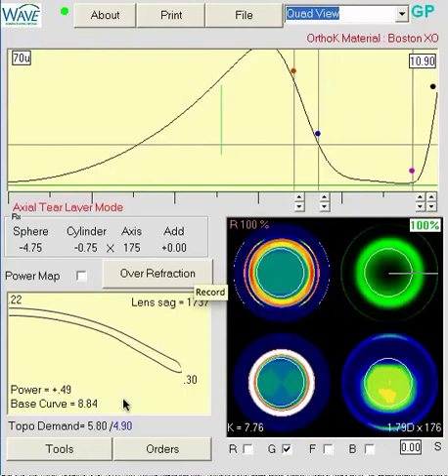This is an orthokeratology case where there's some concern for corneal cylinder and undercorrection. The patient has a couple diopters still of residual myopia. And a couple things that come to mind when I'm looking at this case is the patient does have some asymmetric distribution of corneal cylinder.